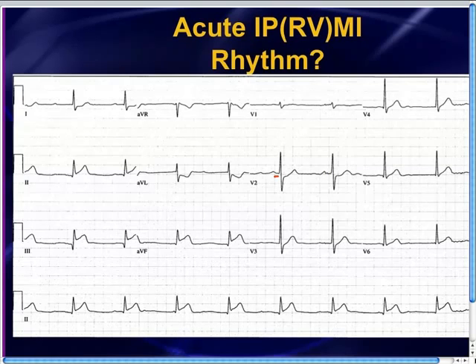Secondly, the PR interval is a little bit different between these two complexes. And then third, I'd pose a question to you: where's the rest of the P waves? Is this little blip right there a P wave? Is that blip a P wave? And if they are, then these should map out, and they don't map out. So you really have to question whether these are P waves, because it doesn't make sense to call these P waves at all.